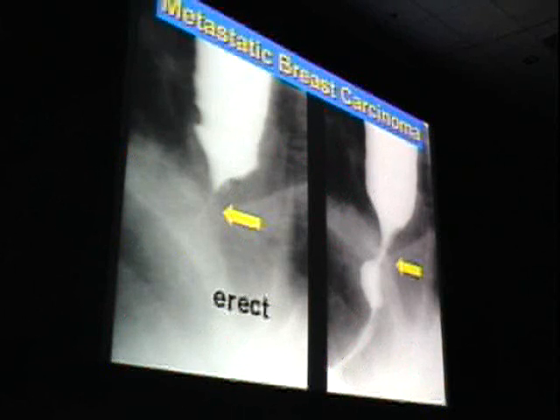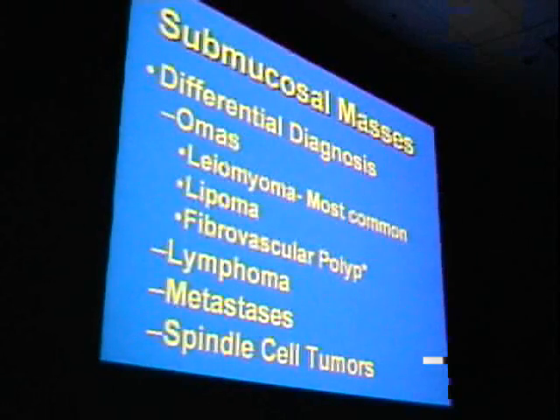So every time you see a lesion that looks malignant, you want to always mention primary tumor, lymphoma, and metastatic disease in the same sentence. What I see the residents doing a lot of is they'll jump back and forth between benign and malignant conditions. And if you don't mention those three in the same sentence, you'll usually leave one of the three out, and it usually ends up being what it turns out to be.